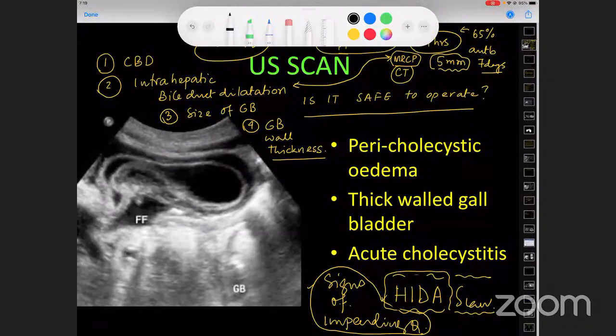First of all, in a setting of symptomatic gallstone, if we do an ultrasonography and we don't see anything inside the gallbladder lumen, only air, and you see pneumobilia where there is no history of previous instrumentation, and you could see the CBD is reasonably well, but the biliary radicals are filled with small air bubbles, that is pneumobilia, as well as an irregularly thickened, partially contracted gallbladder having multiple air bubbles inside.